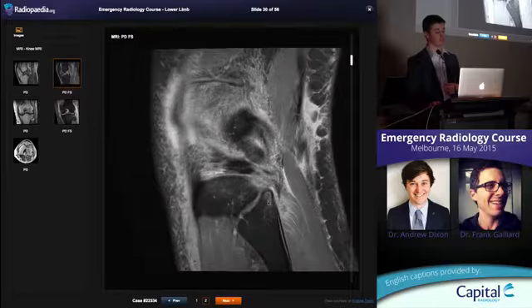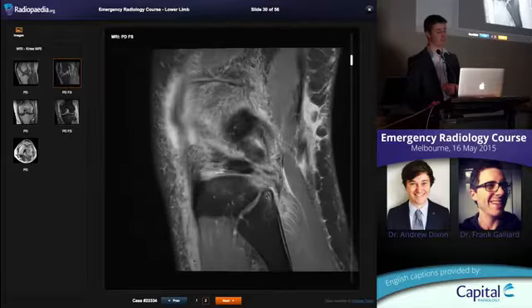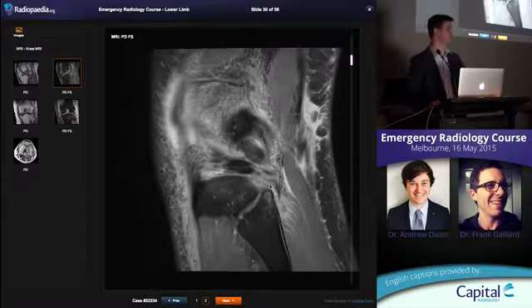Again, look, a little bit of marrow edema. It hasn't actually pulled off, but this is the biceps tendon. There's been injury to that, and it's wanted to pull off a little bit of bone here. These are the posterolateral corner ligaments, the arcuate ligament complex. They're all hyperintense, partially torn. So this patient has got a posterolateral corner injury, but there's no little fracture there.